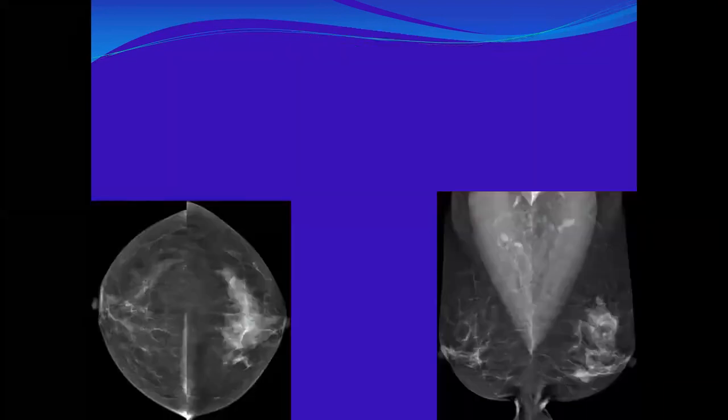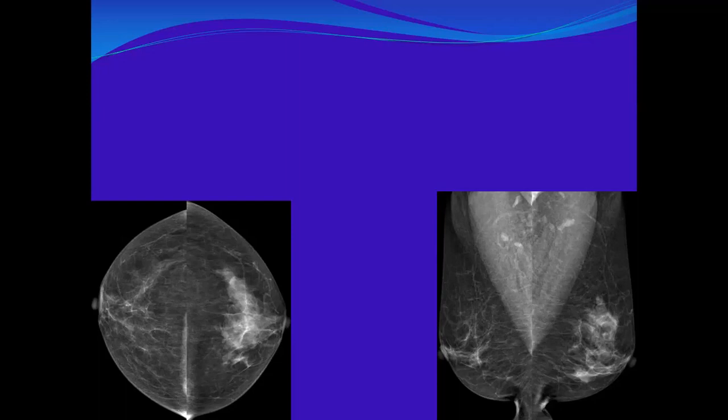Okay, what about this? Suhair. This is craniocaudal and bilateral oblique view, giving a global asymmetry at the left breast, with normal skin. Excellent.